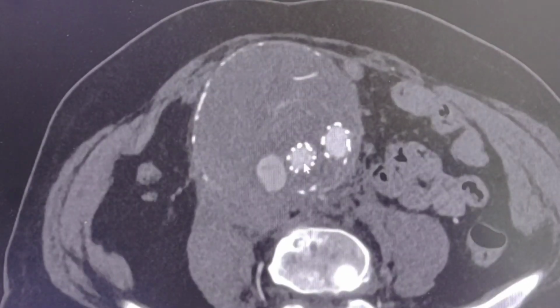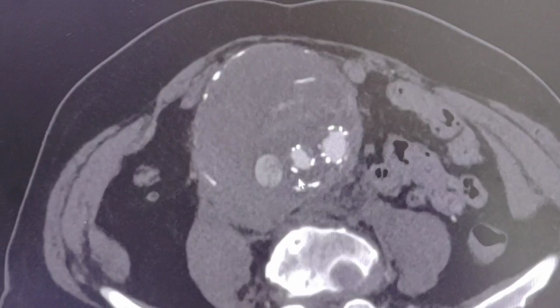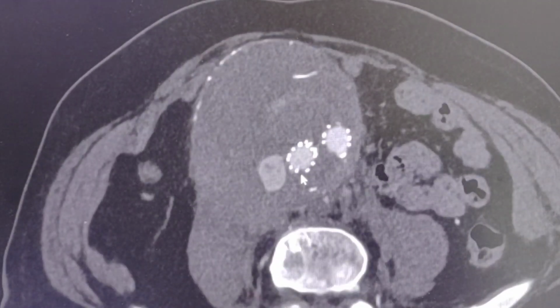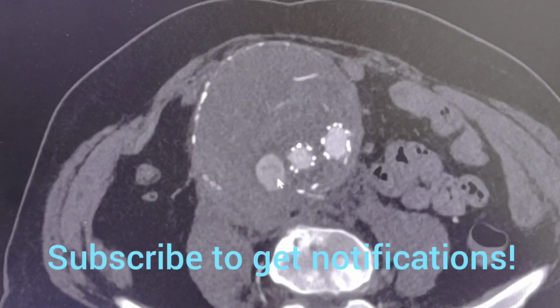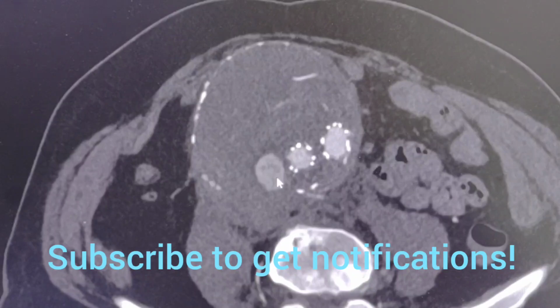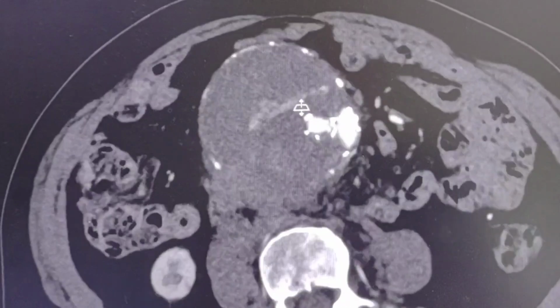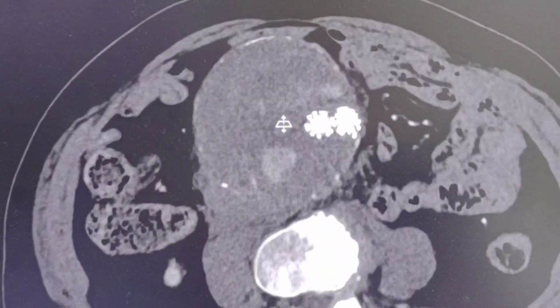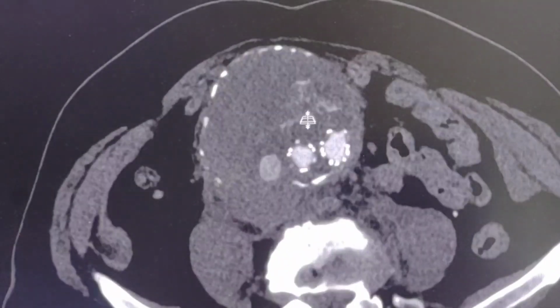Now, as for endoleaks, there are 5 different types. We may discuss it in a different video, but this type of endoleak probably represents type 3 or type 4 endoleak, resulting in this aortic rupture. Of course, there is intraluminal thrombus, which shows inhomogeneity due to the leakage. This is IV contrast.